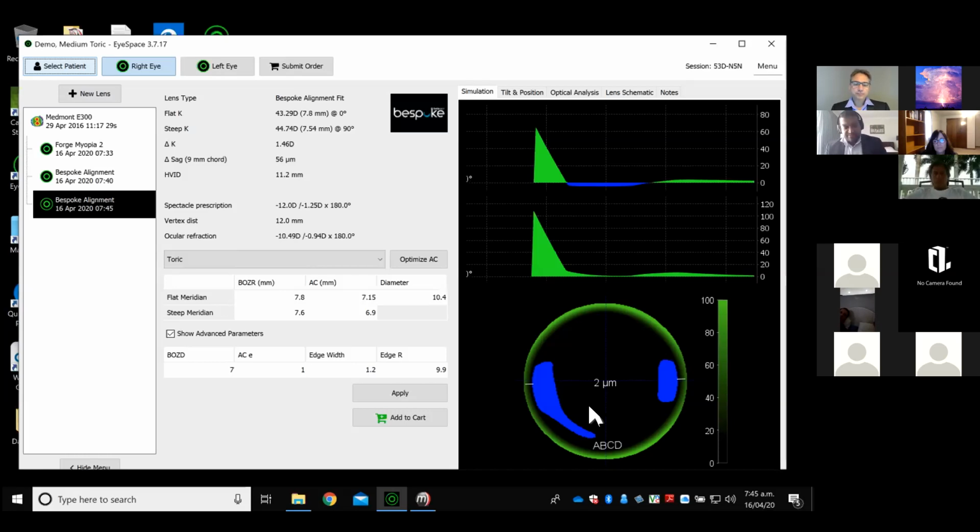So this probably depends on our fitting philosophy. I tend to fit my rigid lenses or daily rigid lenses a little bit flatter than most, with that 3-point touch or feather touch type appearance. So when you look underneath a fluorescein simulation, you'll have minimal fluorescein there. And as we know, if a lens has less than 20 microns of fluorescein underneath, it will not illuminate. So it may appear as if there's touch when really there isn't.